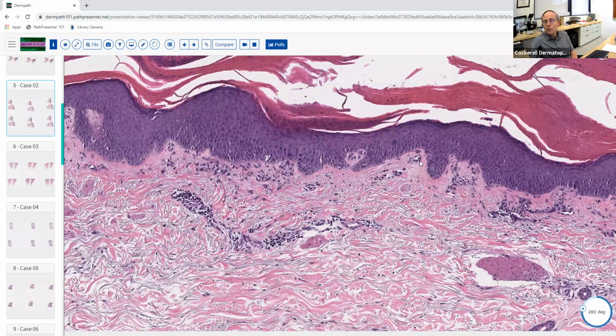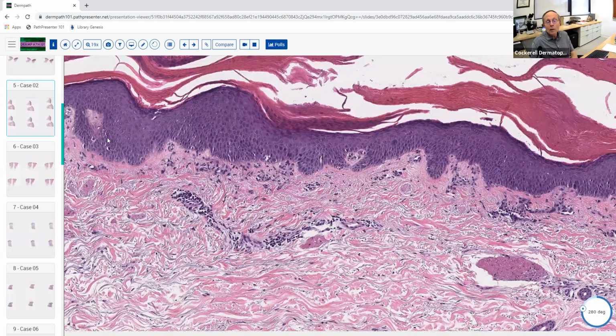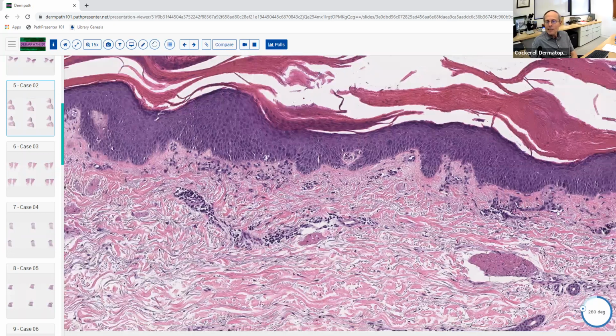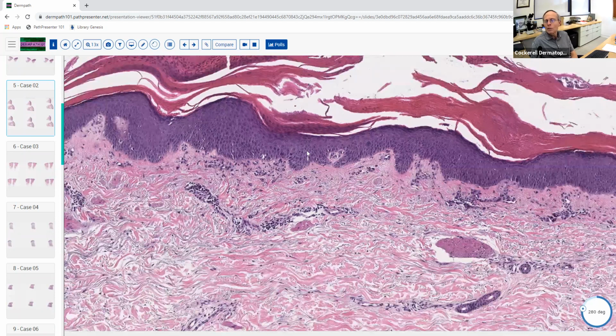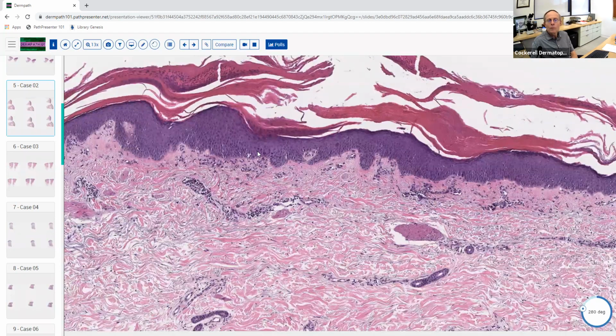And it is irregular. You've got these sort of thick, fat epidermal rete ridges that have probably coalesced in a couple of areas, like over here. And so that's actually a clue to this diagnosis. When we see this entity, which I'm sure you probably already have a good idea of what it is, you don't really see the florid, prominent, long, thin epidermal rete ridges like you see with psoriasis. So that's helpful. Tell me a little bit about that cornified layer.